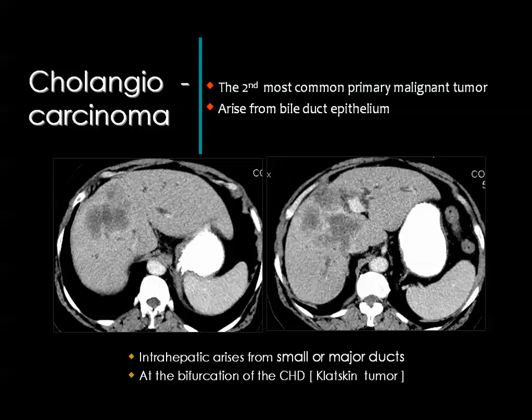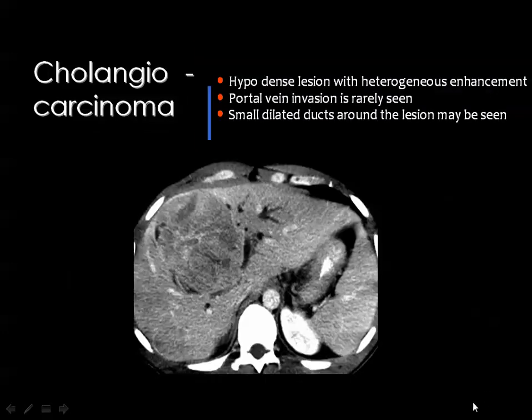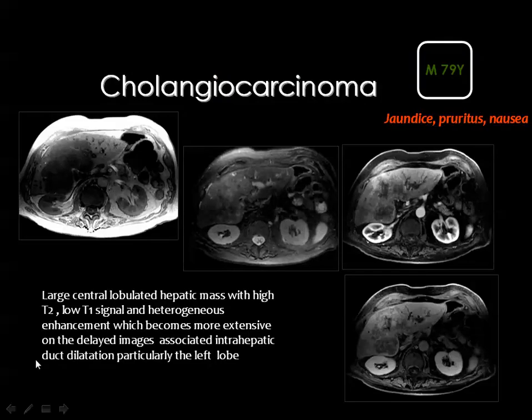the bile ducts, but the incidence of hepatocellular carcinoma doing this is far below the incidence of cholangiocarcinoma, which is almost 100% invading the bile duct and obstructing the bile duct. And if you see a mass surrounded by dilated biliary radicals, you expect the possibility of cholangiocarcinoma.